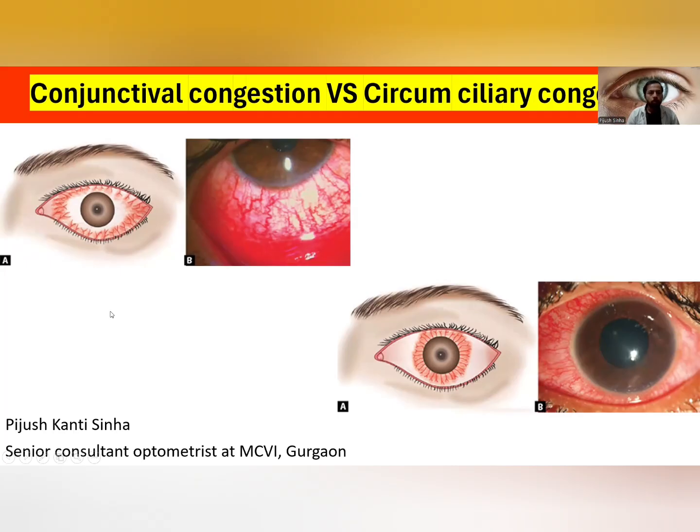Today in this video, I will discuss a very important topic that is very useful for your clinical practice. Here I'm going to talk about two signs in the eye that we most of the time get confused: one is conjunctival congestion and another is circumciliary congestion.